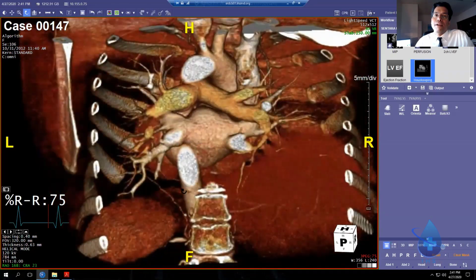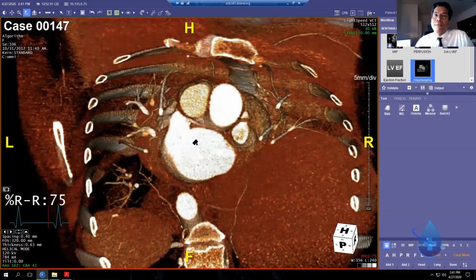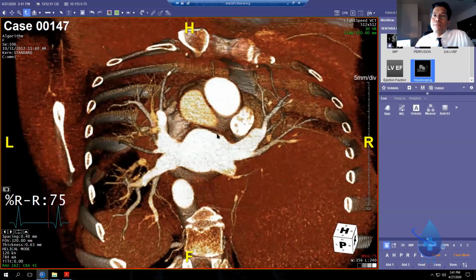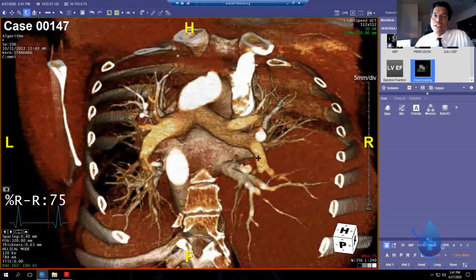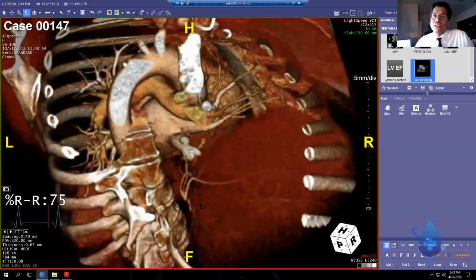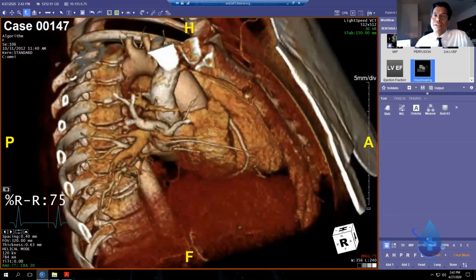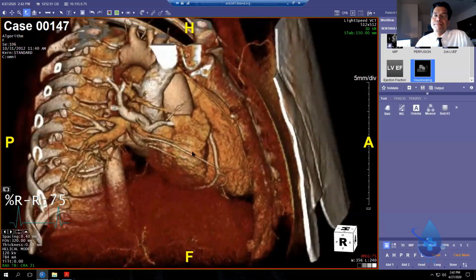Here's the pulmonary veins coming into the left atrium and the appendage from a posterior view. On Thursday, I'm going to show you about 15% of people have an accessory appendage sticking off here. A couple of times I've seen a clot in the accessory appendage, and it makes it very hard to do a cardioversion after a TEE now. I pretty much put all my patients on Eliquis for 4 weeks without doing a TEE cardioversion.